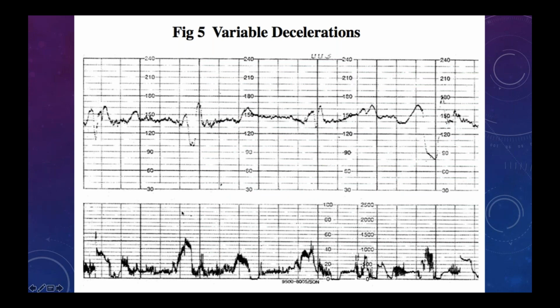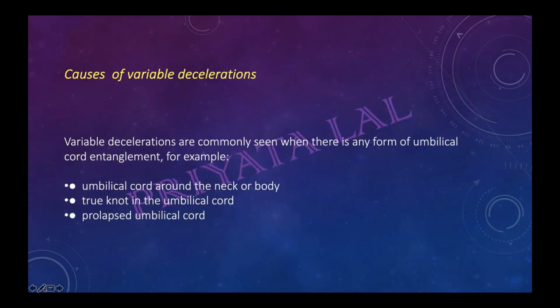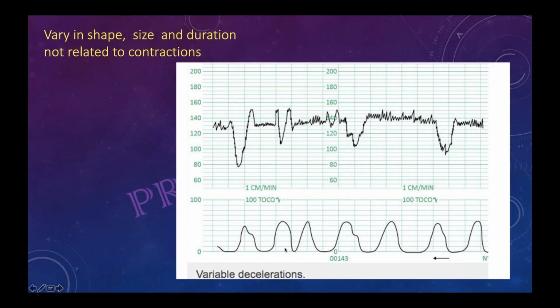Can I interrupt? In the previous picture, the first one is an early deceleration. Yes, the first one is early deceleration, it seems like.